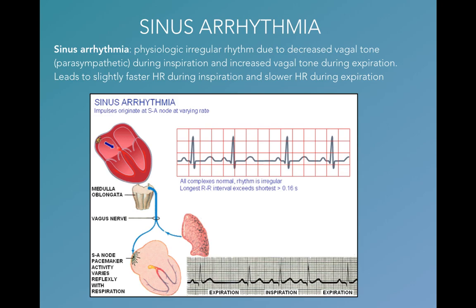Now, it's not always going to be that dramatic. It could be very, very slight. It's not in everyone. The EKG won't always pick it up. But it's a good thing to know. So if someone says, this is sinus arrhythmia, what do you want to do? Well, you're going to say nothing because the patient's just breathing.